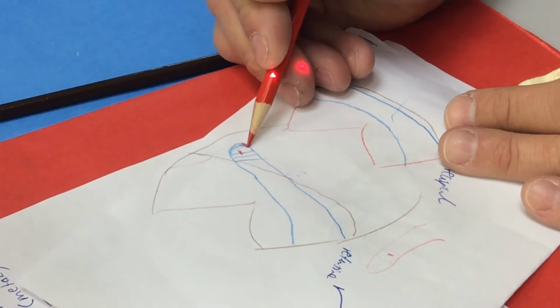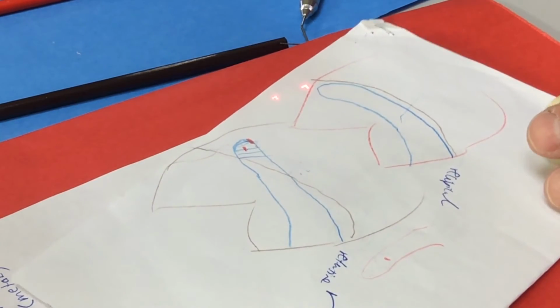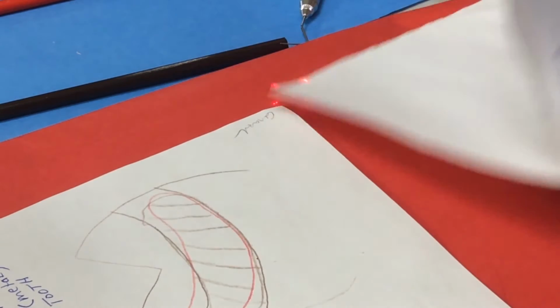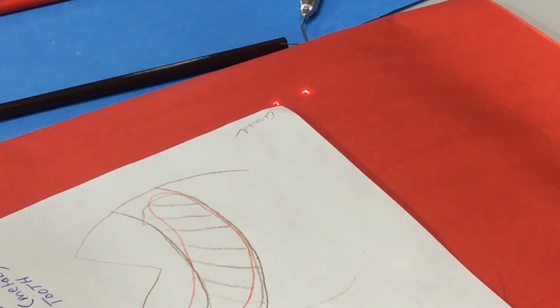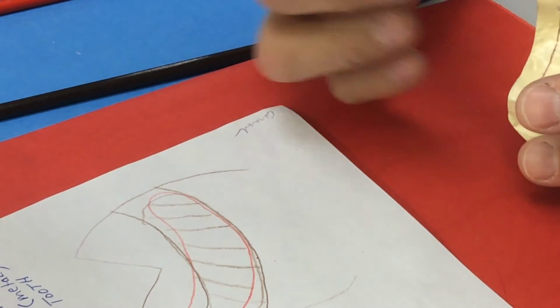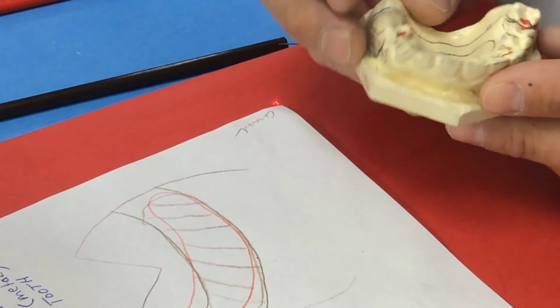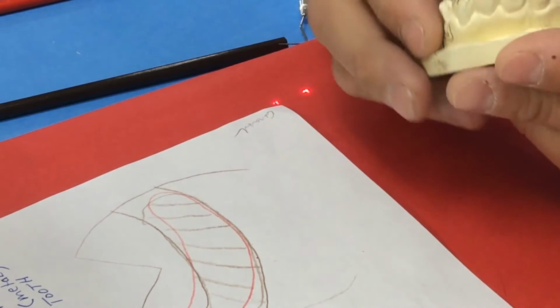So with the circumferential clasp, the undercut mark goes right at the bottom on the retentive side. Remember coloring in a framework too. I saw that someplace today. Coloring in a framework is something we do in the drawings on the lab slip. It's not something that we do on the cast. So you don't really want to color in your framework. If you look at any of our examples, none of them have been colored in.